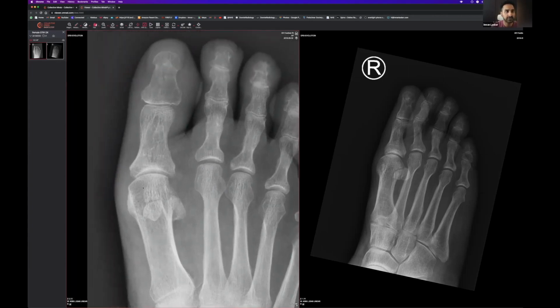Now we come across to the toe, the big toe. We can see that this doesn't look quite nicely angled. It's kind of angled towards that way, isn't it? So if I drew a line, it's not going straight, it's kind of angled off that way. So this is going to be a Hallux Valgus, leaving the midline of the body, the Hallux Valgus deformity. Someone has picked it up. Well done. Okay, and then this is what I was trying to tell you about.